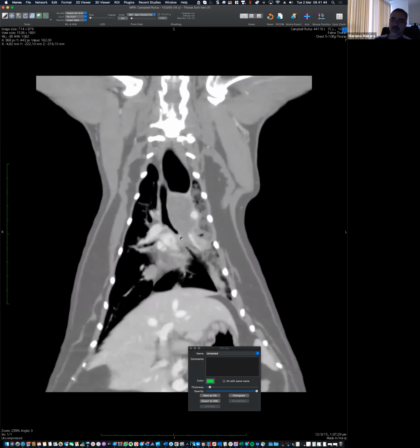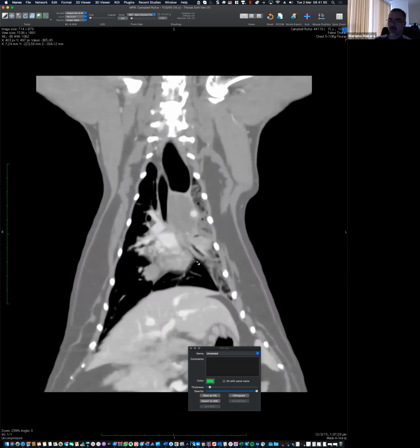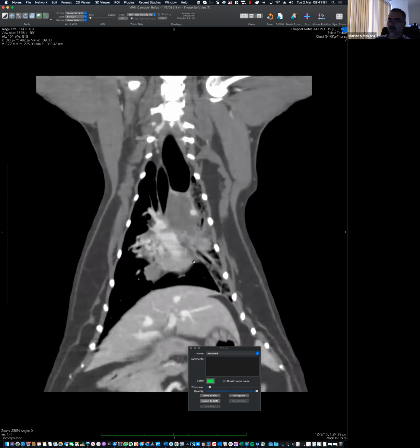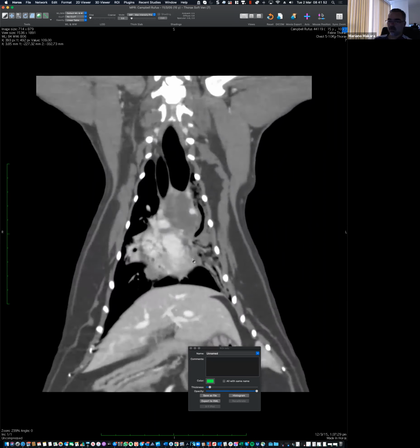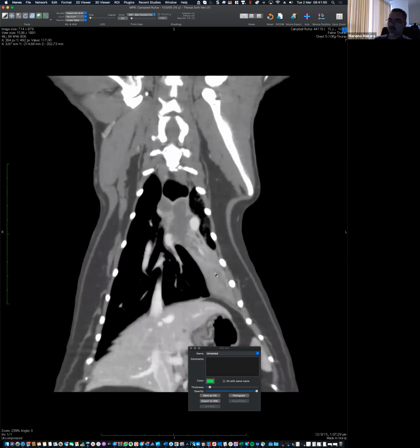Makes sense, in more than collapse, there is something replacing that. There is soft tissue within that airway. And if we follow it more, okay, beautiful. So look at this lung.